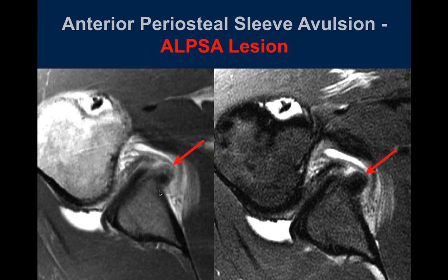You have scar tissue all over the place there, don't you? Yeah, this is probably the inferior glenohumeral ligament. Again, we're only seeing one cut. We'd have to characterize it by looking at all the images through the area. But that's still a tissue of scar tissue. There's got to be something. It's not fluid. Yeah, well, it's not a normal shoulder. You're right. Yep.